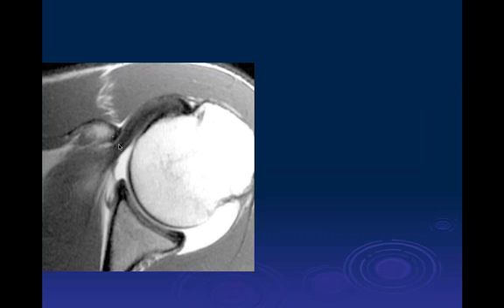Yes? Hi, sorry. May I ask you a question about the measurement? Does the degree of internal rotation affect you? For example, say if they were just poorly positioned in the gantry, or does a certain degree of rotation affect your measurement or throw you off in one way or another? Yes, it does, and I'm going to talk about that in just a minute. Good question, Deshali.